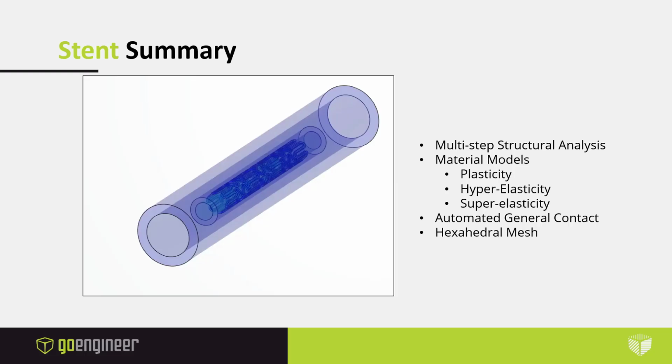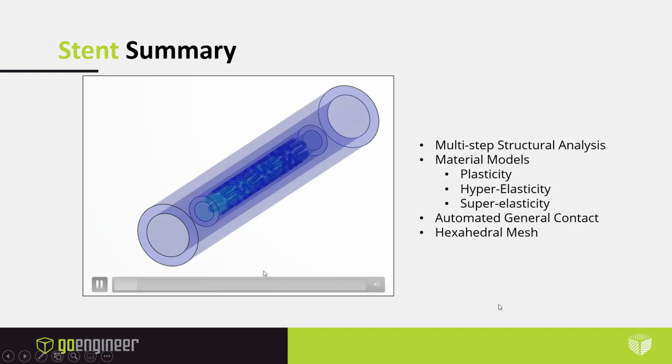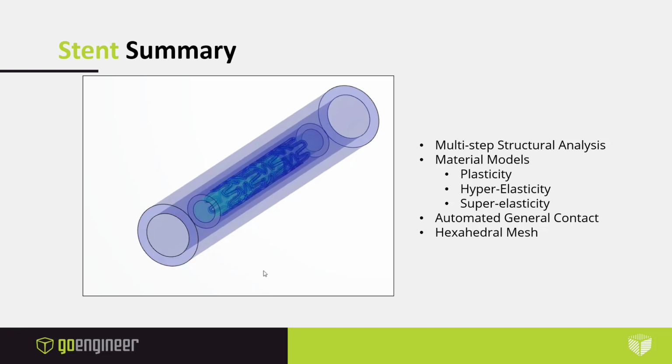Again, to summarize this entire process, here's another video of the stent deployment. Again, you can see the crimping tool catching the stent, and then the balloon pressurizing the stent to catch the artery wall.